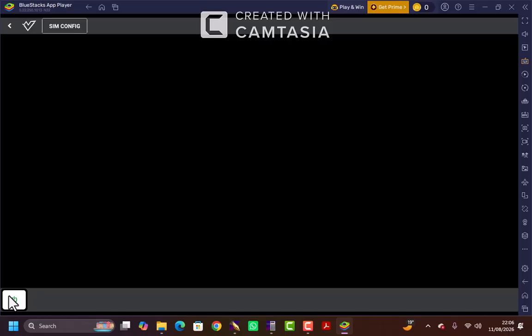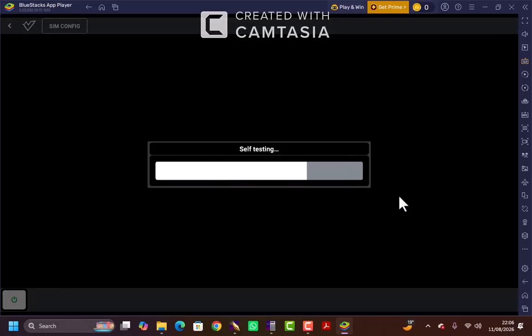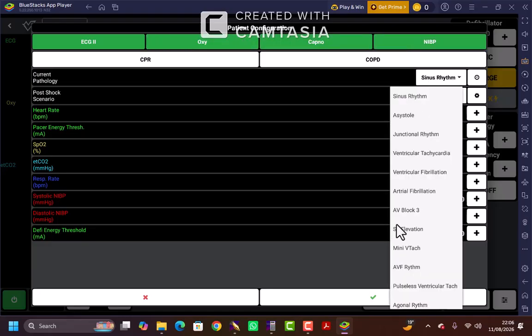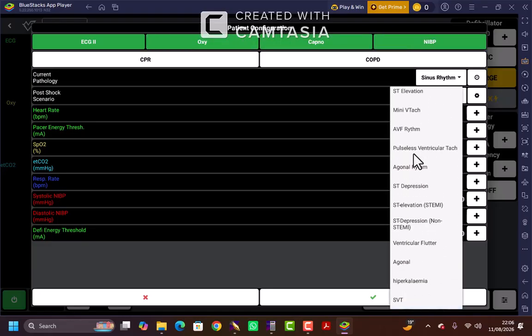Okay, we'll test the scenarios in my app. Okay, we'll test the scenarios.